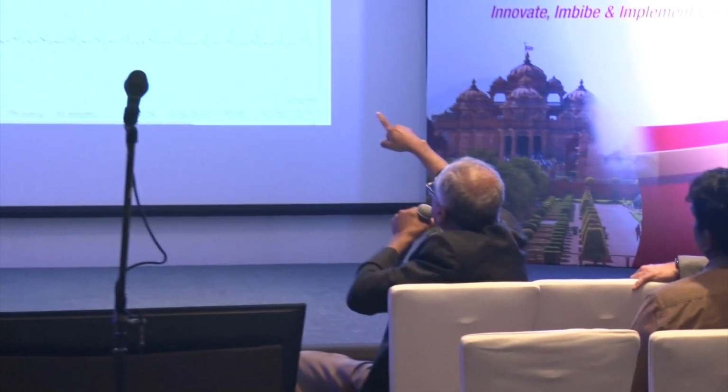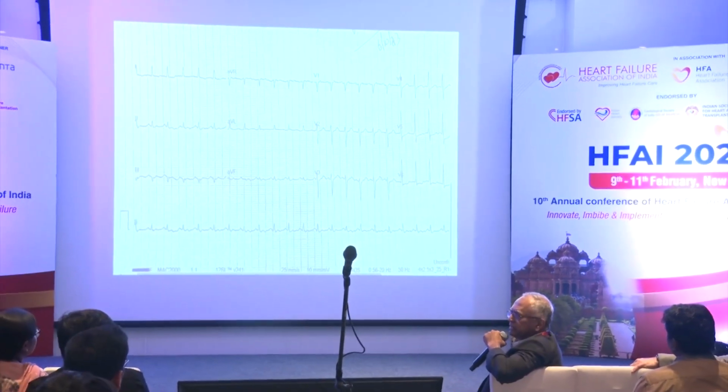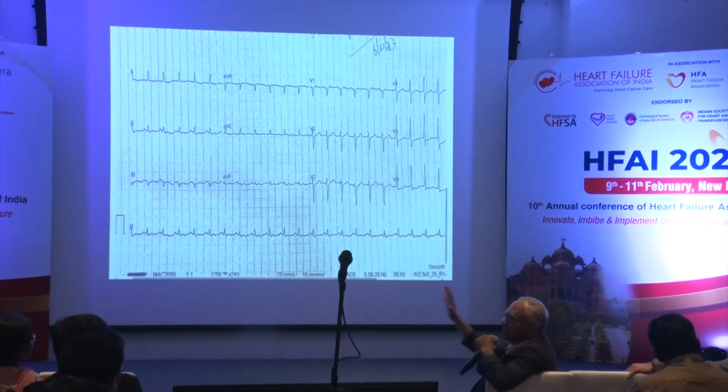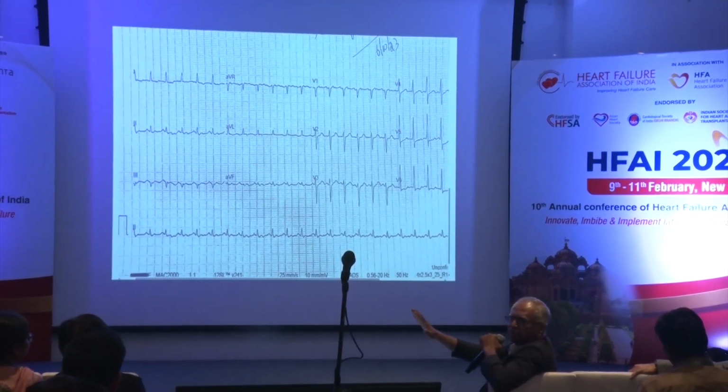Such of you who are there, you have to go back to the basics. The right atrial activation is followed by a delayed left atrial activation. The left atrium is a posterior structure, so the wavefront will move away from the sternum. You will invariably have a biphasic P wave in a sinus P wave. When a P wave is completely positive in V1, it means all the wavefront is coming from posterior to anterior. Do you understand what I'm saying?